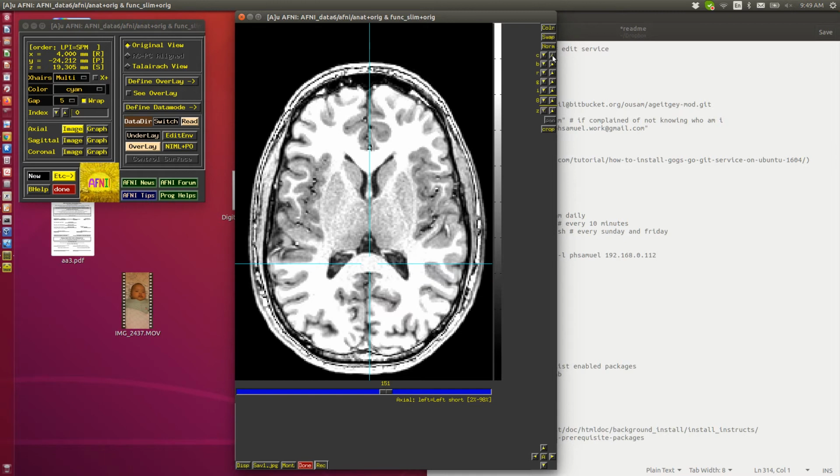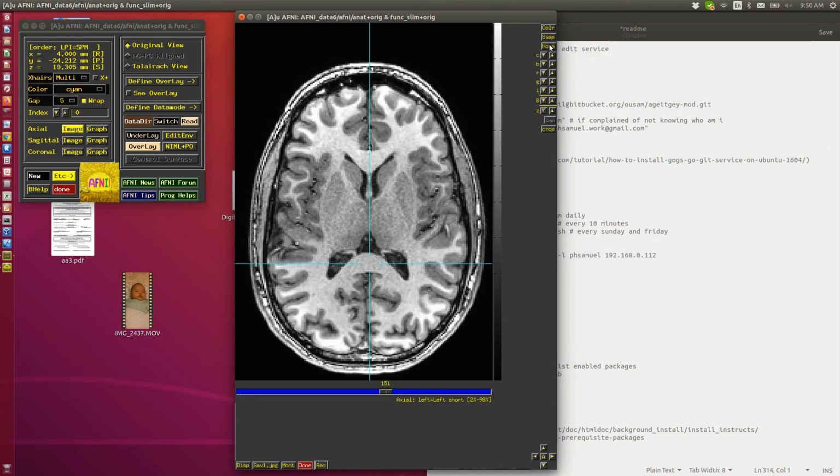What can I do to fix that? Make it normal. Take a norm, I guess. Norm! Like the actor, the character in Cheers, or the people in Norman, for example. Norm makes it normal. That's the default setup. It may not be what you want, but at least if you really mess it up, you can get it back to something that's usually tolerable.